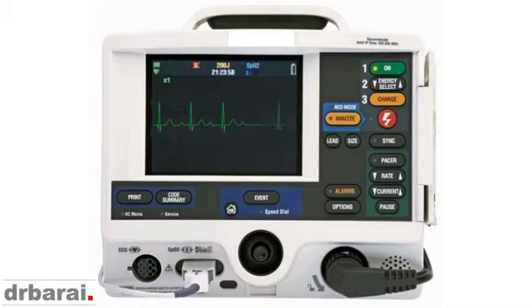Let me show you how Mobitz type 2 looks. So this is a Mobitz type 2 second degree atrioventricular block. What you can see here is, again, a P wave followed by a QRS complex, P wave followed by a QRS complex, P wave followed by no QRS complex, so there is a dropped beat. If you carefully look at the PR interval, it is constant. There is no progressive prolongation of the PR interval like in Mobitz type 1. So this is Mobitz type 2.